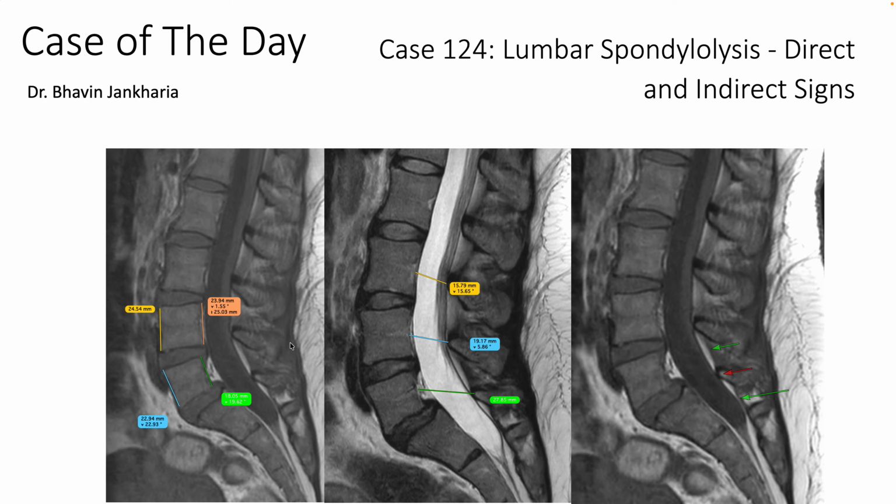This is case of the day, and today is the 124th case. I've lost track of which week or month we are in. But it's a very simple enumeration of the direct and indirect signs of lumbar spondylolysis.